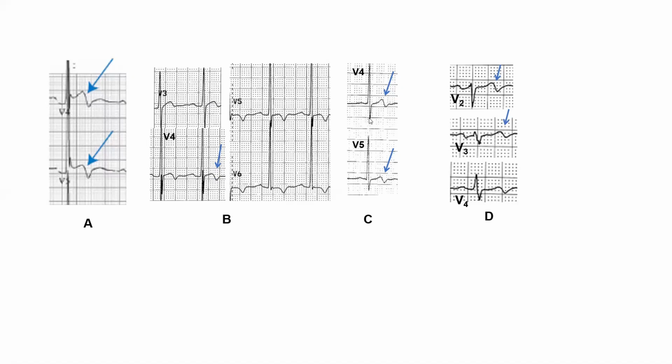C, I want you to look at this. This is a patient, a 52-year-old man who's presenting with chest pain. He has this in leads V4, V5 only. And you can see this is not Wellens. It's concave. It's not straight, the ST segment. And it's a smooth downslope.